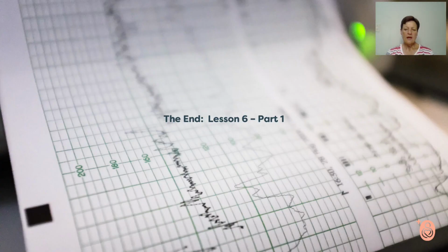And that brings us to the end of lesson 6, part 1, where we've done all the abnormalities of the baseline and the baseline variability. And then I'll see you in lesson 6 part 2, where we'll do all the abnormalities of the decelerations and the contractions.